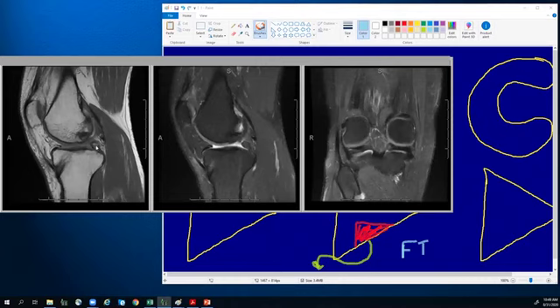And if I don't see an answer in the next 30 seconds, I'll just narrate the situation. All right, great. So I do see some responses where someone's saying avulsion fracture and someone's saying metaplastic ossification. Metaplastic ossification is very interesting. And I do think to a certain extent that's what's going on here.